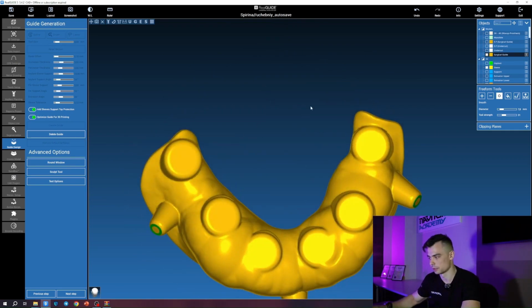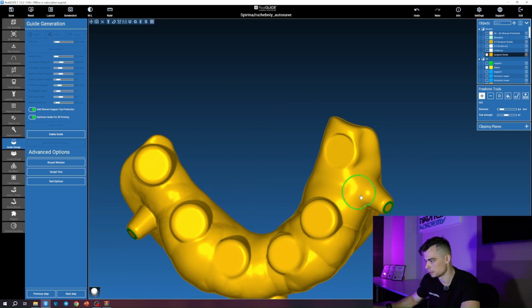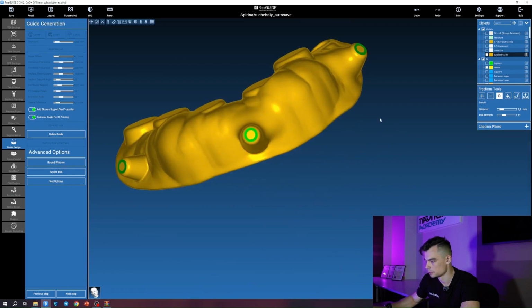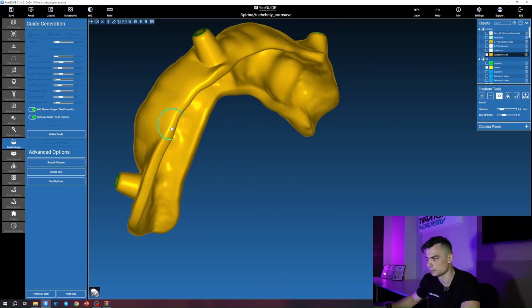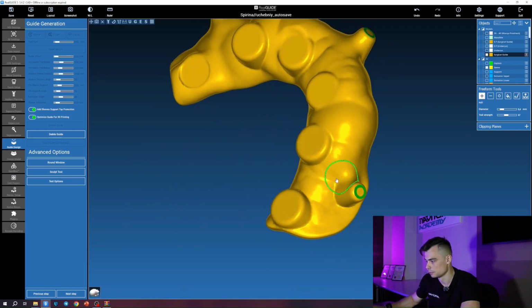We'll just mention it. And now, as we've already discussed, we add resin in the critically important areas. Here, we definitely need to add resin in the area of the fixation pins. We can also remove this excess part here. Well, not exactly remove, more like smooth it out. That would be a more accurate way to put it, because it doesn't serve any purpose, and on the contrary, it will just make us wait even longer. Although, in any case, the procedure itself will already be quite traumatic, I would say.